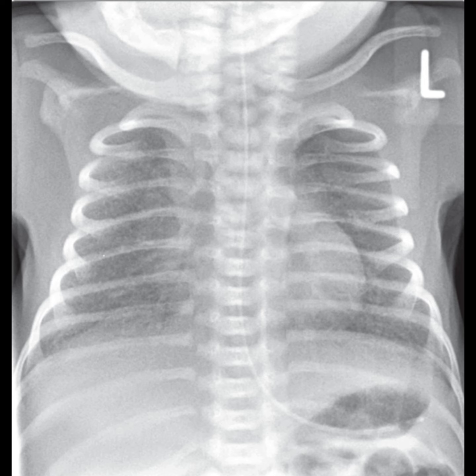Moving on to respiratory distress syndrome, RDS, which is sometimes referred to as hyaline membrane disease or surfactant deficiency syndrome, this condition is primarily seen in premature neonates. It usually presents within the first few hours after birth due to the lung's inability to adequately expand. The radiographic features include low lung volumes unless the infant is intubated, and a diffuse granular or reticulogranular shadowing that can become confluent. Air bronchograms are a significant finding here, often spontaneously resolving within 7 to 10 days.